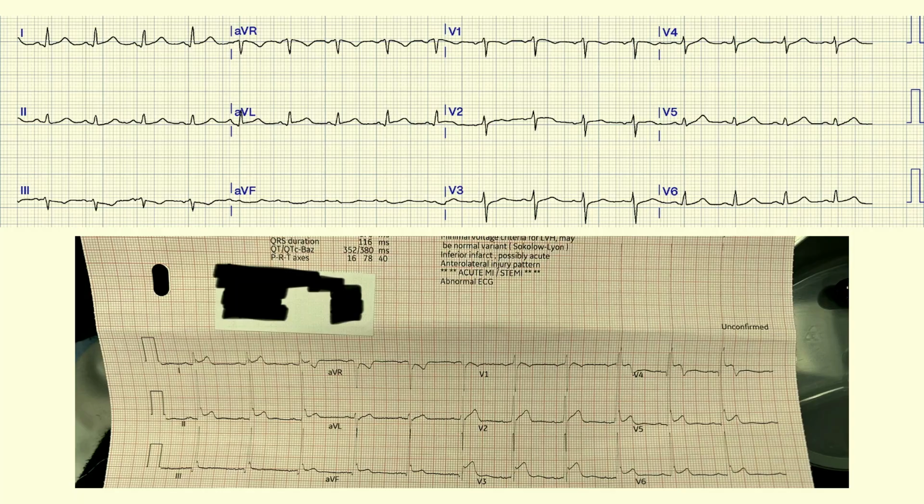Everyone was convinced this guy had pericarditis. He got 1 million rounds of colchicine. His cardiac MRI was normal. This is an uncommon normal variant. It's called benign T-wave inversion. By the way, do you see how big the R wave is in V4?